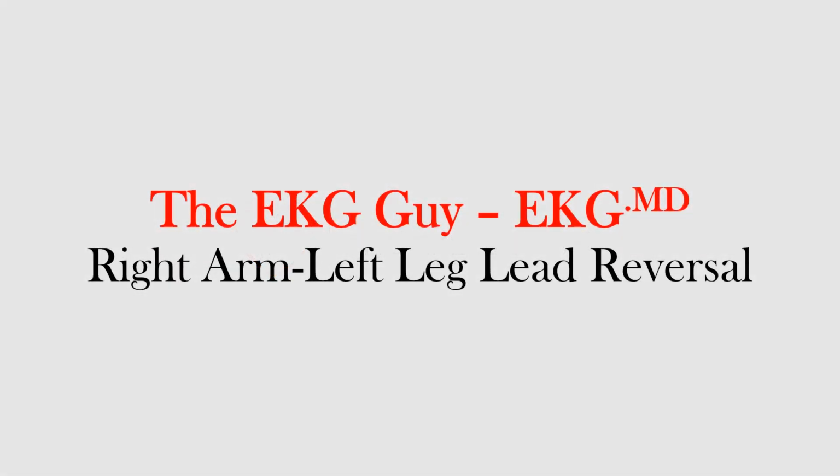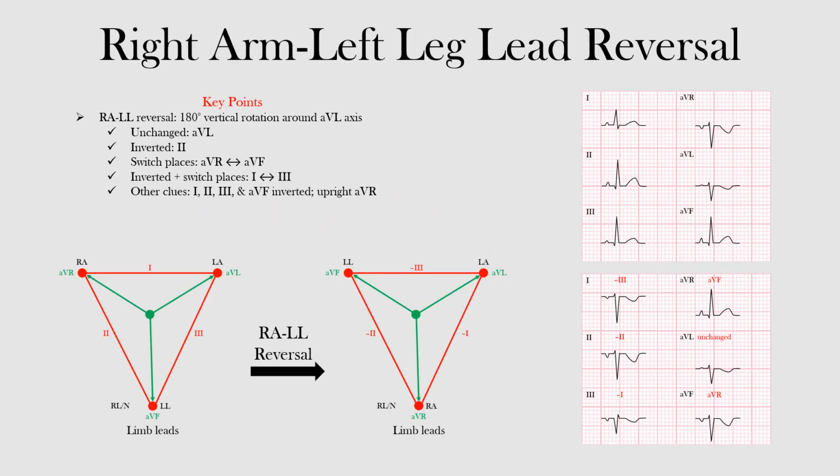In this lecture, we will discuss right arm, left leg lead reversal and how to identify it on the EKG. Making sure that the EKG leads are connected to the correct electrode position is important for getting accurate rhythm strips in 12-lead EKGs. If the leads are reversed, we call this lead reversal, and it can often produce EKG abnormalities.